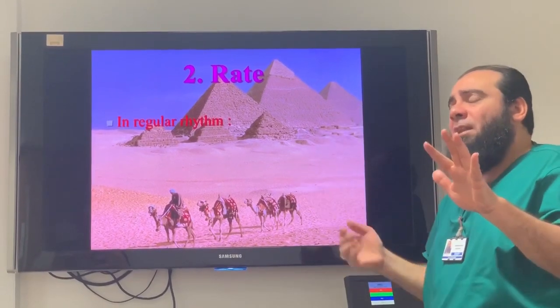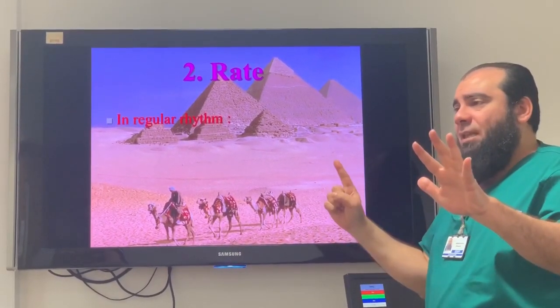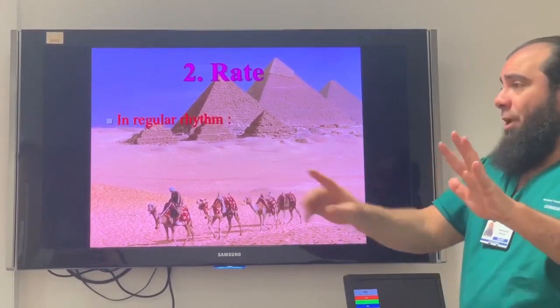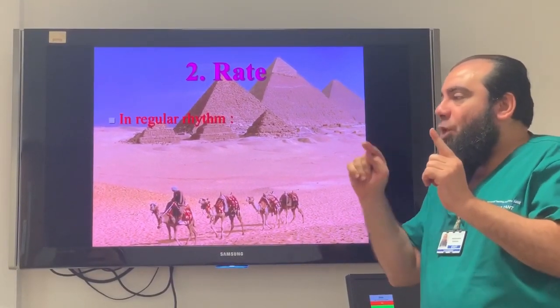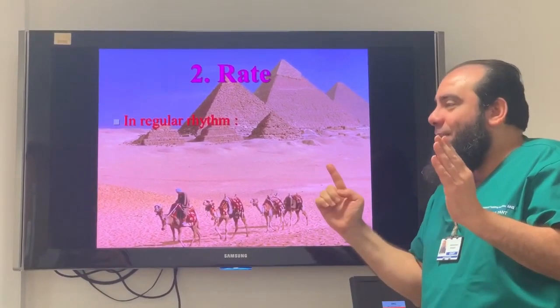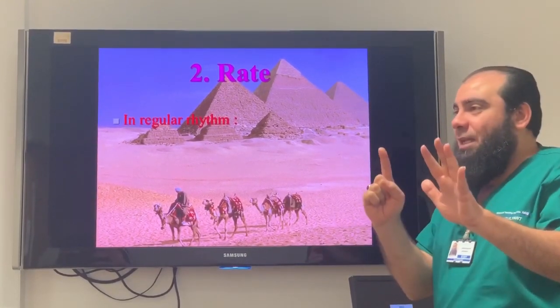Then I can multiply until 1 minute. I'll give you an example. 5 big squares is 1 second. Is that right? It is the rate of the paper. Calculate another way: the tiny small square is 0.04 and the big square is 0.2 of a second. Then 5 big squares is 1 second. Use whichever way you are convinced with. So 5 is 1 second.